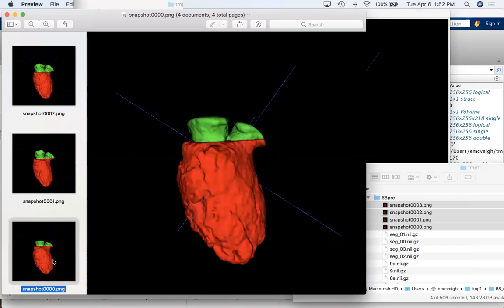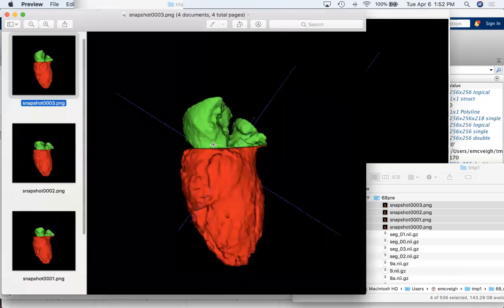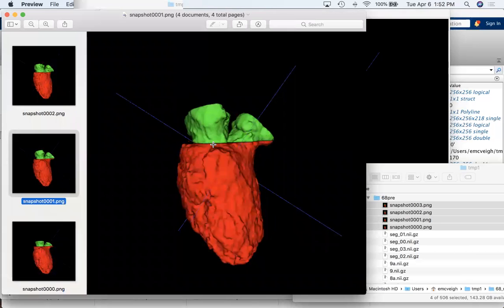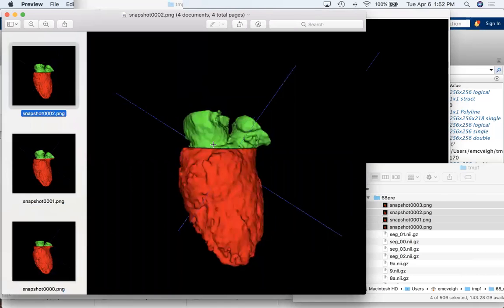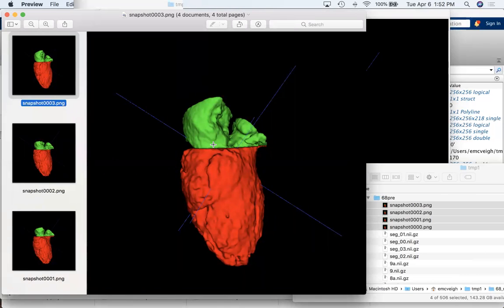And it's a little distracting because the tops change. But we can cut those off later. But I think it's pretty good for the valve plane. Right. So that's the way I do it.